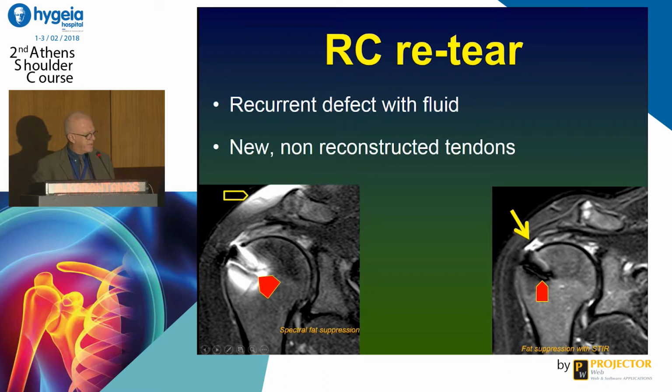with a lot of artifacts. For instance, usually in musculoskeletal imaging, we need to apply fat-suppressed images with spectral fat presaturation, as we see here on the left slide. However, spectral presaturation is associated with lots of artifacts. See here how many artifacts this metal produces.